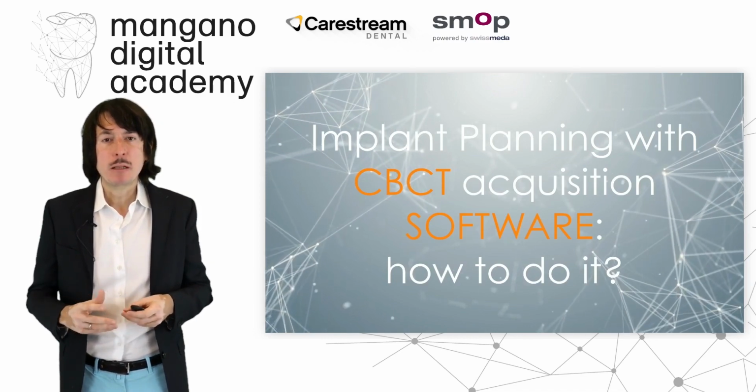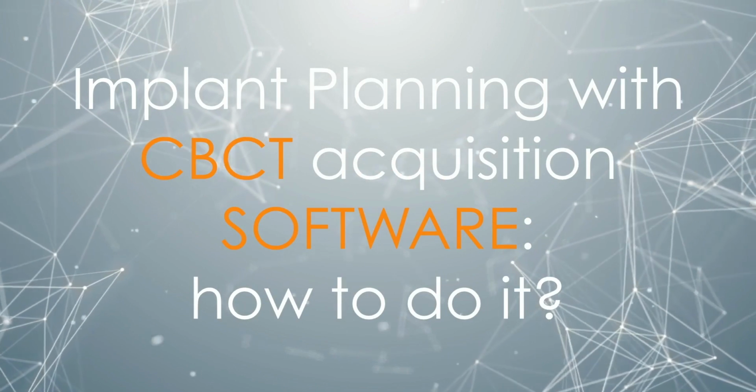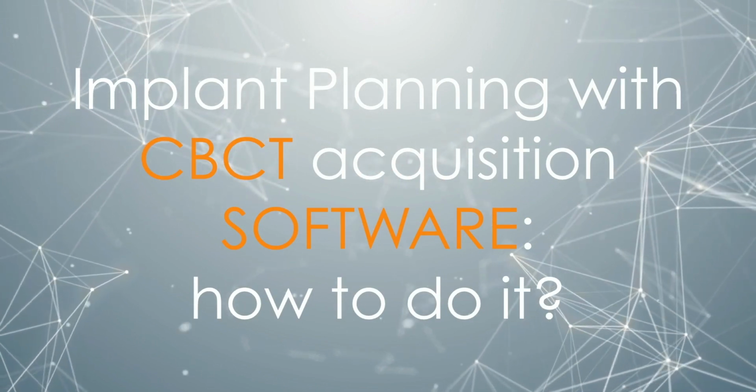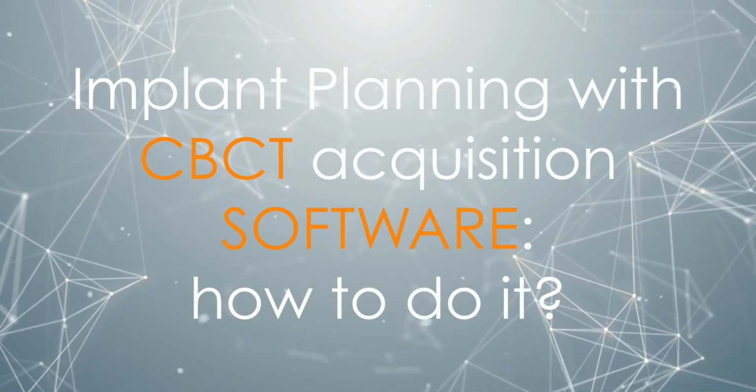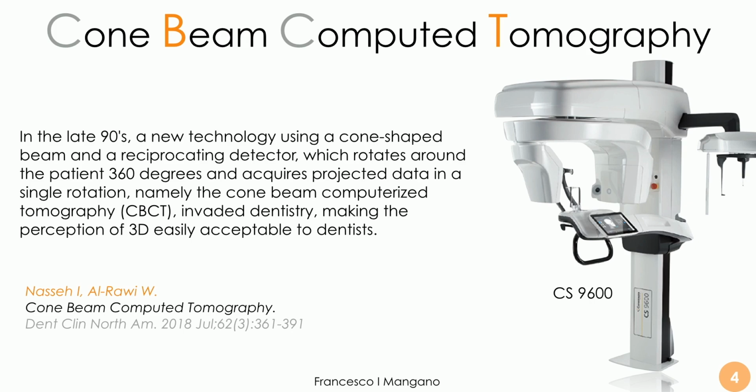So, implant planning with cone beam computed tomography acquisition software. How to do it? How to correctly do it? It's very important to use this software well in order to gather a lot of information that is very useful also later when we plan inside the computer guided surgery software, for example. Let's talk about the cone beam computed tomography.